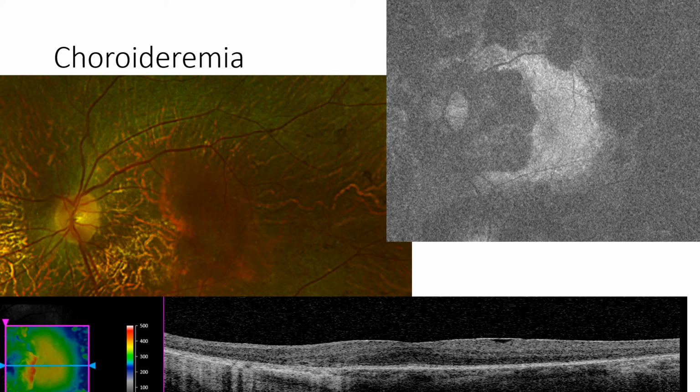So that patient has choroideremia, confirmed by genetic analysis. In the Optos pseudocolor image and green light autofluorescence image, you can see that the area of preserved RPE is here, and that corresponds exactly to this region here. Choroideremia is one of the few diseases where the fluorescein angiogram looks very similar to the ICG angiogram. Because of all the RPE atrophy, you can actually see the fluorescein in the choroid.